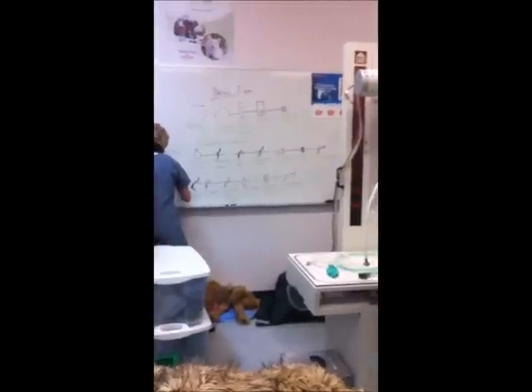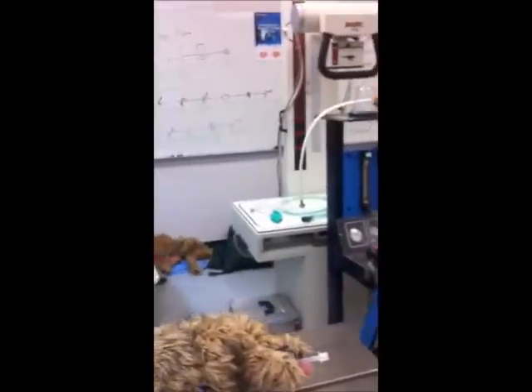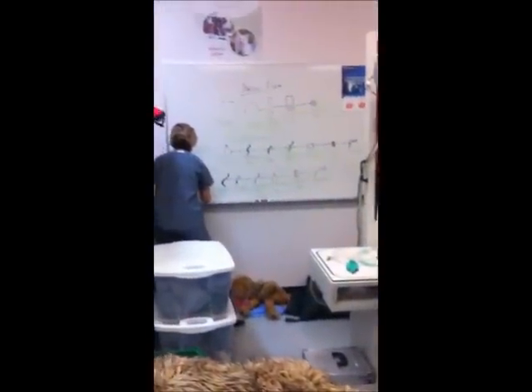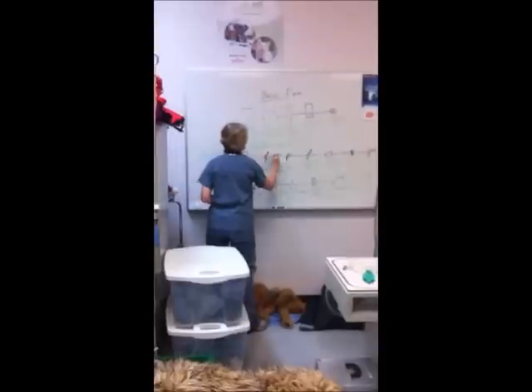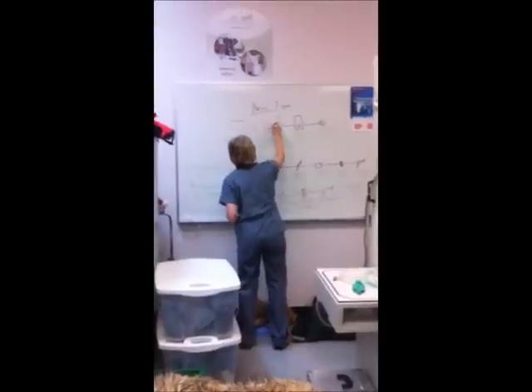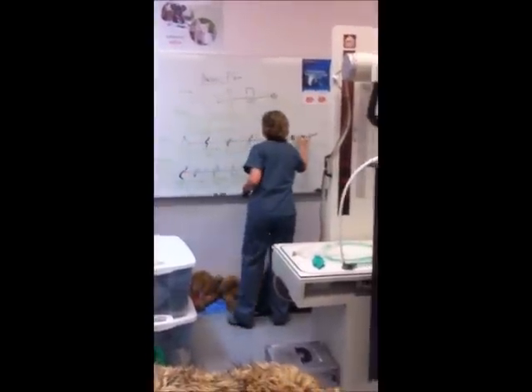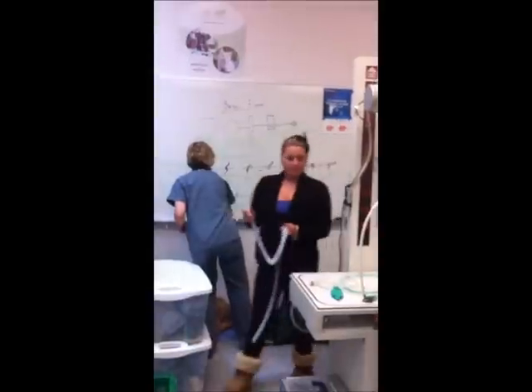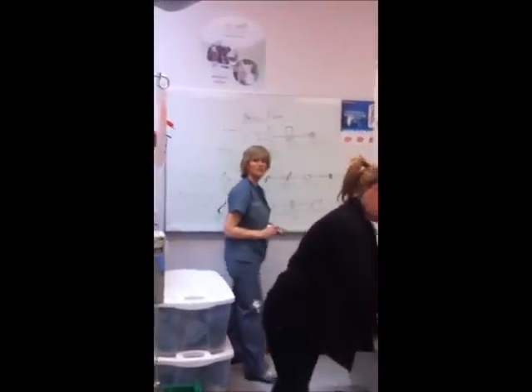Yep. There. No, the black one. I know, that's what I was doing. You can say no. Oh, here. I want to know what I want. So if you're going to show flow, that's flow. Right, all the way through. Okay. What's there, what's in what order, etc. Okay?